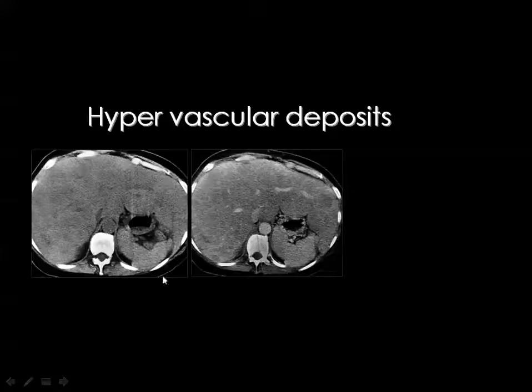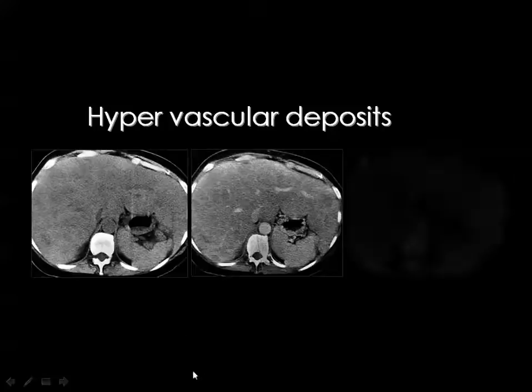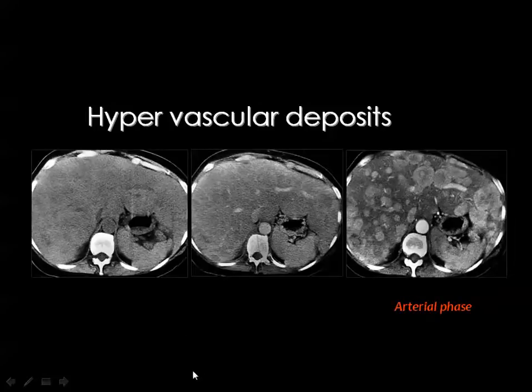You see the liver is enlarged, and you may identify some of the focal lesions inside the liver. But whenever the multi-detector CTs became available in the market, we are able to have this triphasic study, and we are able to scan the liver in the arterial phase when the contrast media is concentrated in the artery. Because you know that most of the hepatic pathology is supplied by the hepatic artery, while the normal liver parenchyma is supplied by the portal vein.